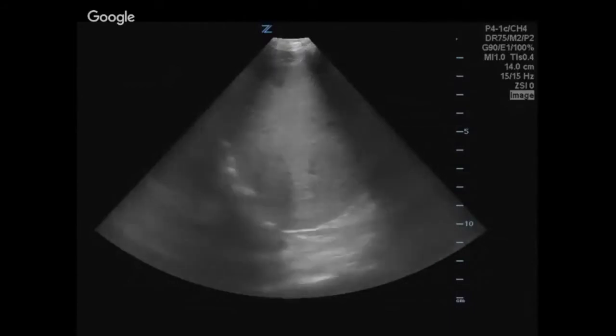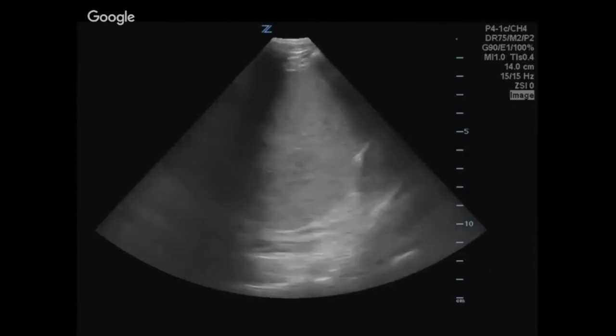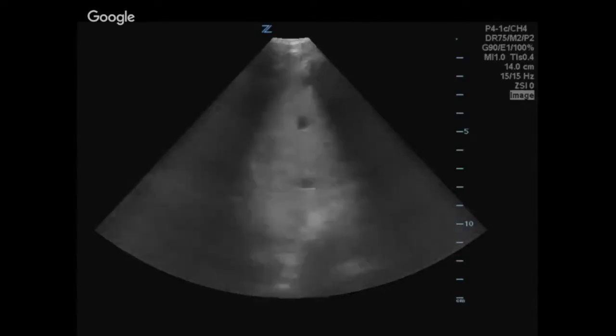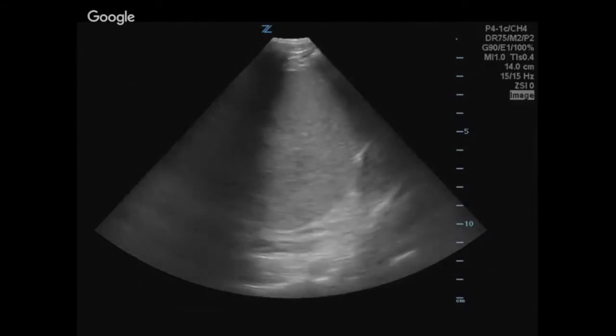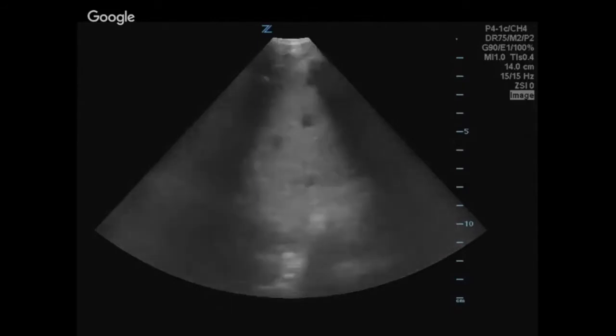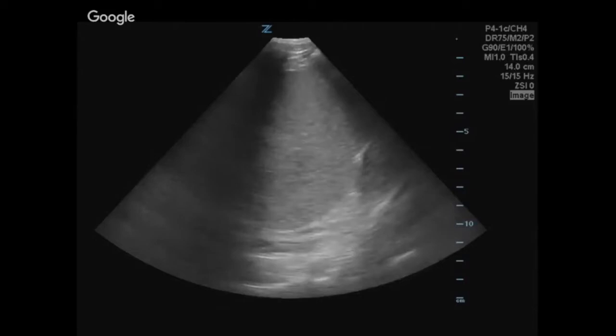I just came from Uganda, so everyone that had cysts in the spleen was like, definitely parasites. No, it could be, but we're actually in the same spectrum as all the previous images. So it's lymphatic malformation, but you're right, should definitely think about parasites or TB, yeah. Here is a simple lymphatic malformation. I mean, simple. So it's more like microcystic lymphatic malformation of the spleen.